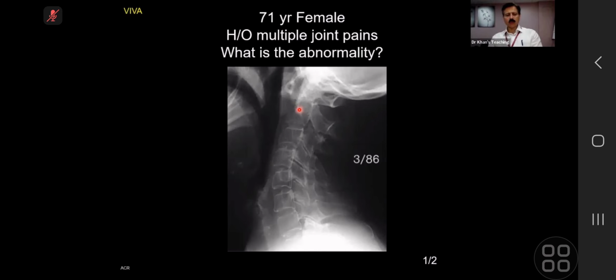Excellent. Can I stop you there? So this has been pointed out. This is the anterior arch and this is the dens, and this distance is increased. In the exam, of course, you can ask the examiner that you want to measure it. If they want you to measure, they will ask you to do it. Otherwise, they will simply agree with you because they have got limited time. Having said that, candidate 3, what is your conclusion?